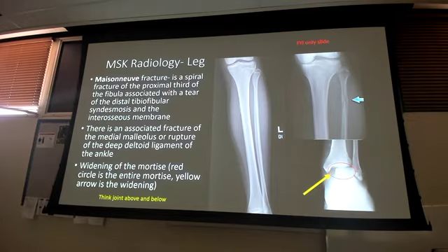I'm not going to test you on this. This is in here for a couple of reasons. One, you're probably going to see it in ortho. And two, this is something that you cannot miss in clinic. This is the Maisonneuve fracture. I don't do French, right? It's French. It's not Nueve. I say that because that's what I call it in my head before I learned how to say it. It's like Mason-Yeo fracture.